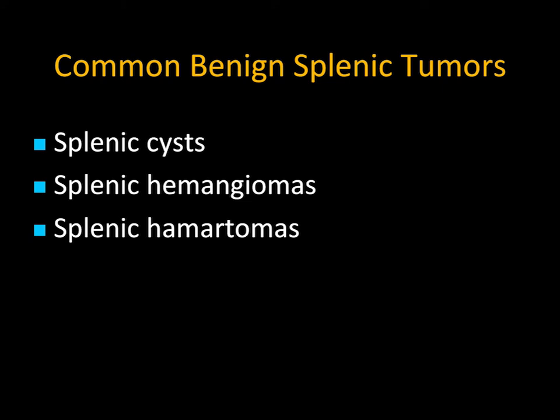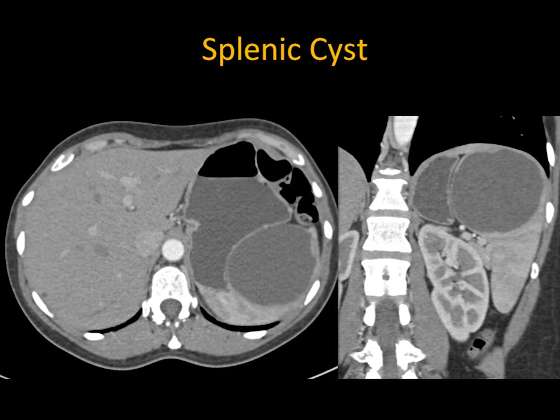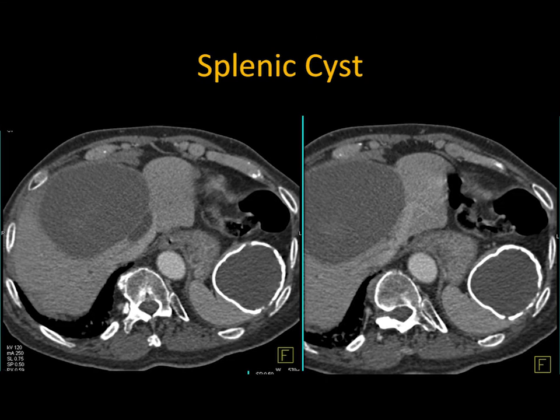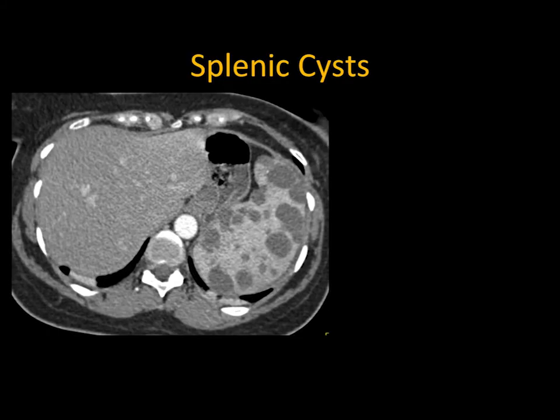Now, I mentioned the big three of benign tumors. Splenic cyst, that's easy. You can get cystic mets from ovarian cancer, but then it's more implanted on the surface, and it has nodularity and thickening. Cysts can calcify. The other thing that can calcify are old hematomas, okay? But dense calcification like that, you know it's a leave-alone benign lesion, coronal plane as well.